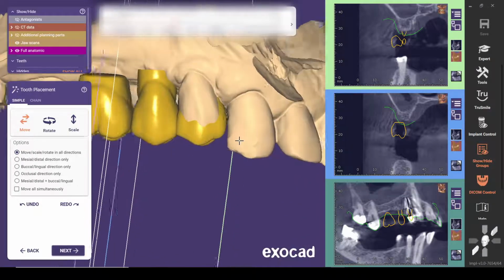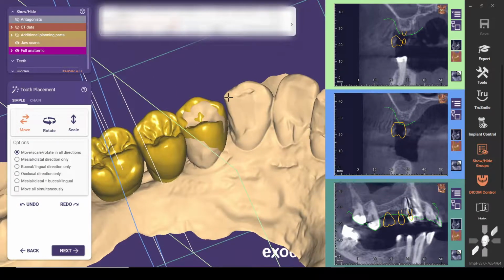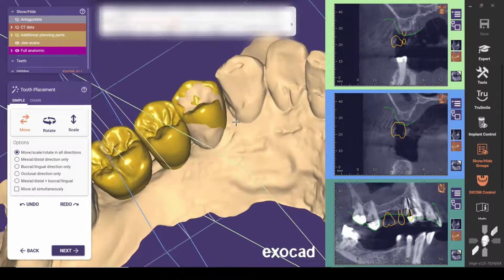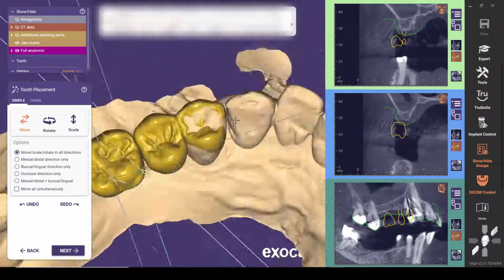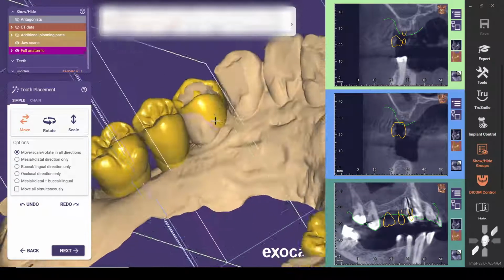I would like to get a better contact there. I think more than likely this tooth is going to need some help contour-wise, maybe recommending composite restoration there prior to delivering a crown, because that's a pretty poor contour to deliver a crown to. Good way to get recurrent decay.